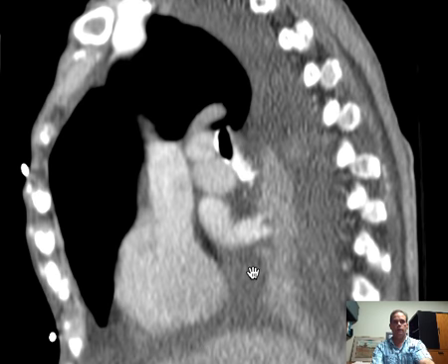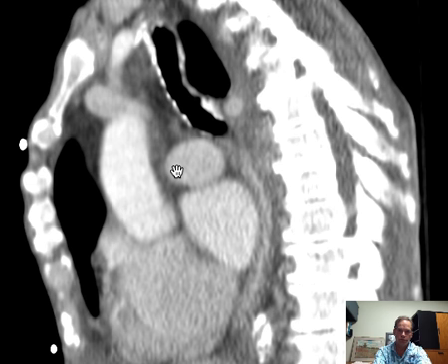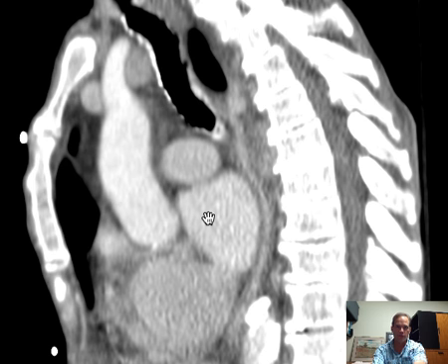All right. Well now, here's something I just stumbled upon. This is the heart, I'm pretty sure of that, and something is coursing up out of it or to it. What might that be? We'll cover that in a moment. But you can see, is it the aorta? No, the aorta comes up a little more anterior than that. Is it the main pulmonary artery? No, because we know that that's very anterior. So let's go through this a little farther. Okay, which is this then? Is this going to be the aorta or the main pulmonary artery?